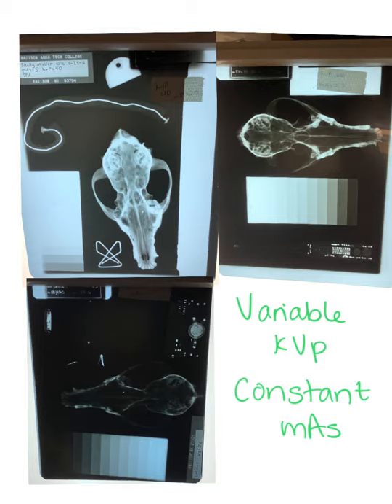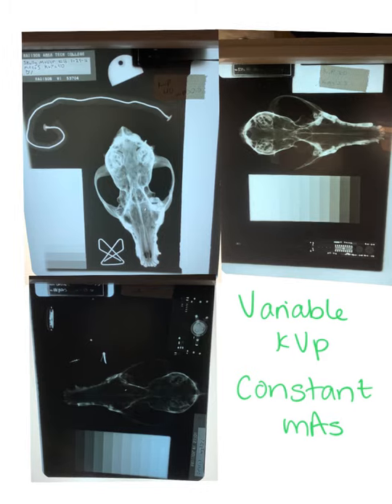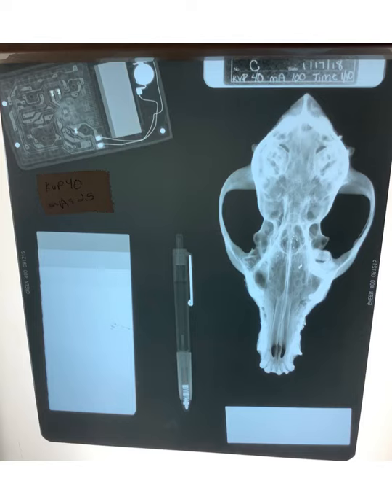On all three of these, the MAS was always 2.5. MAS didn't change. The number of x-rays hitting the film didn't change. That was constant. But the kVp did change. The first one we'll be looking at has a kVp of 40. The next one we'll look at has a kVp of 60. And the last one has a kVp of 80. You guys can probably already see some mild changes on these. Next few slides here, I'm going to go through these in more detail.